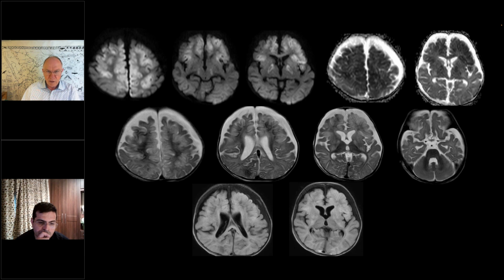Kish, what do you think? Can I? So just a couple of things. All images have to be interpreted in the clinical context, and for me, this is very likely a complication following this surgery. We are not accusing anyone, it's just interpretation. I think this is more likely the result of impaired cerebral perfusion, although this may not be documented. This would not be the first time.